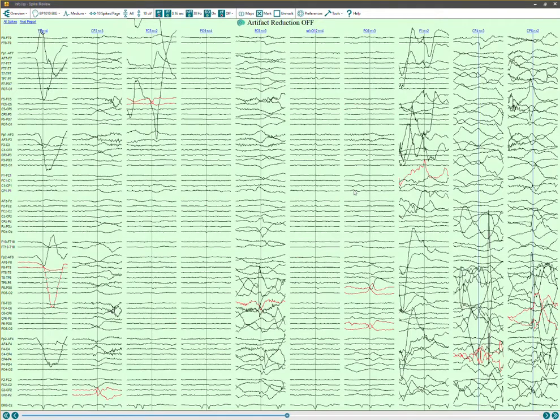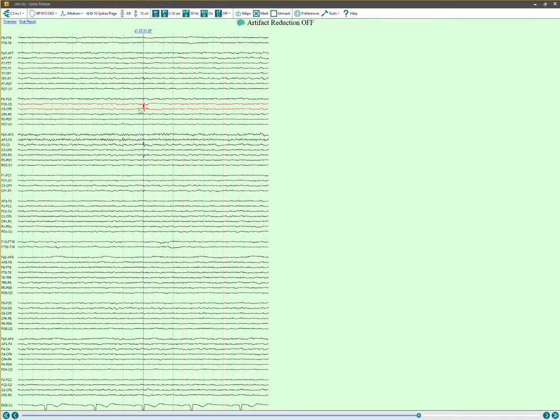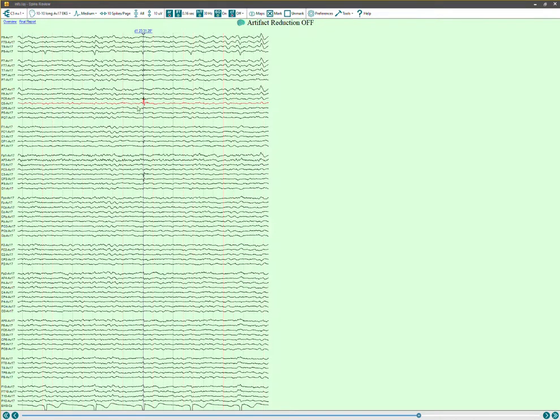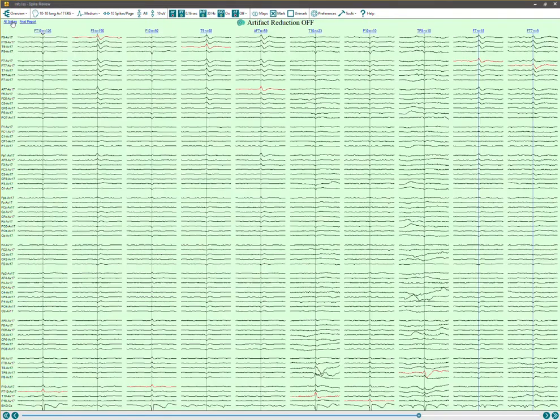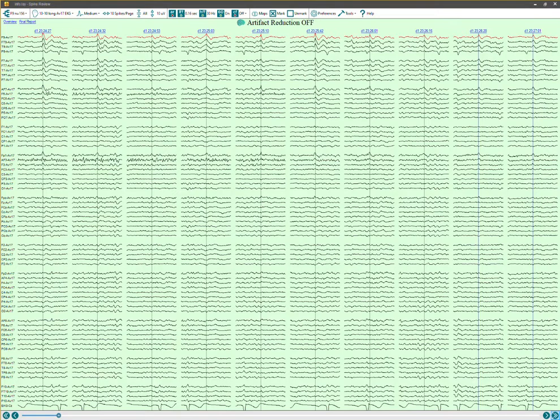Not so much. Again, that's just single channel. Possibly, but it's lined up perfectly with EKG, so I'm less convinced of that. But again, everybody would have a different take on that, because again, it is probabilistic by nature. All right, just by way of example, let's say we've got some here, and we've decided we want to pick some of these to include for further analysis. So to do that, I just go along and I click on the ones that I want to keep.